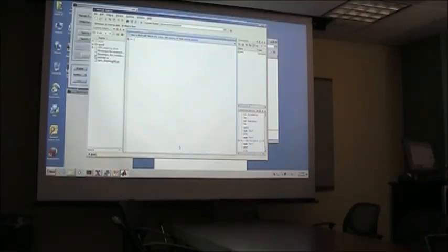I mean, these are the different ones, I think they're just asking one thing. I don't know what these two are. Yeah, you can ignore this. The survey scan is just a short scan you do to set up your field of view, the areas that you're interested in. But this is the thing you want.